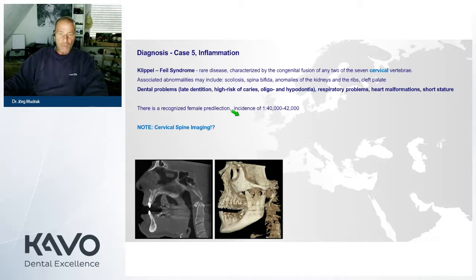If you look at this lateral view, you can see that you have the spine in this area. We are responsible to analyze the whole data, not only what is in our convenience zone, anything. So we have to be aware of how it is looking.